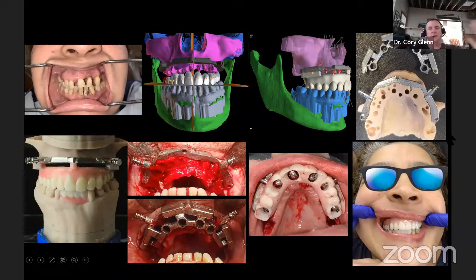All right, so again, the foundation to doing every single one of these cases that I've shown you is bone segmentation. And again, I can't stress enough, if you are a D4 student and you come out of school here in a couple of weeks and start doing guided surgery, and you just get to jump straight into having bone segmented by one button, I can't tell you how much I hate you for how easy your life is.